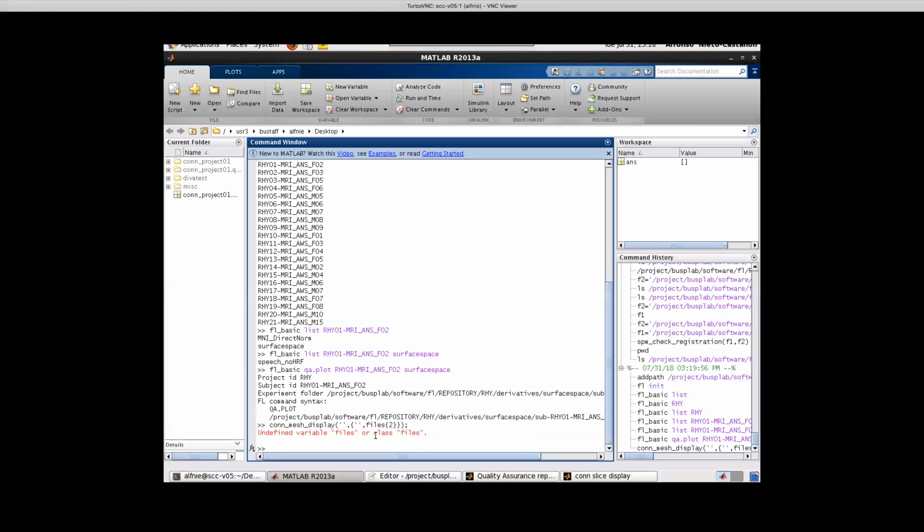And you can tell that it's not perfect when we look at the labels. Some brains, just the morphology is so different than the average template that it really messes it up. Like you can actually completely displace, say, precentral gyrus. Rarely, but occasionally. So you'd want to see those.